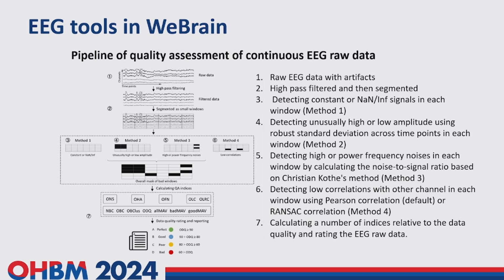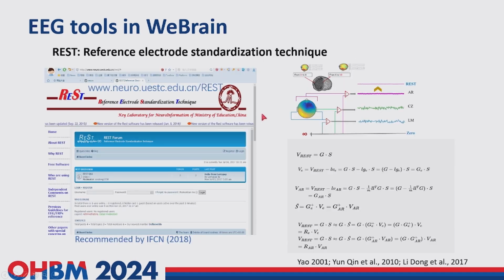And here, the bad channels and the bad blocks can be marked, and these marked blocks are not processed in the following analysis.